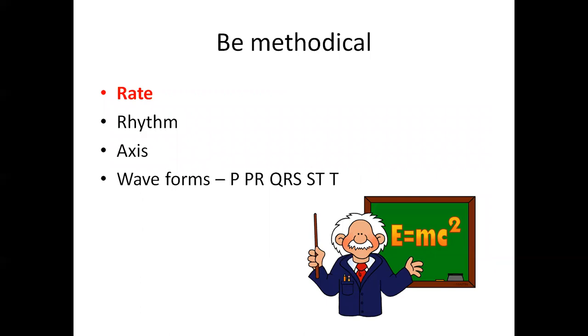Now we are ready to start reading the ECG. Two principles that you have to remember. One, always be methodical and follow the same sequence. I cannot stress this enough. You have to follow this sequence. That is critical. The second is you have to practice and practice and practice. So if you ever see an EKG, grab it and quickly follow this sequence.